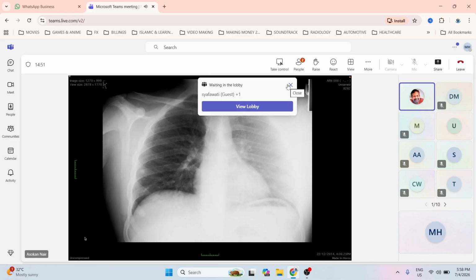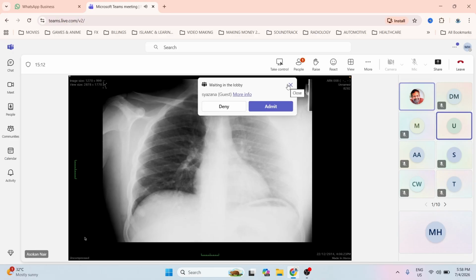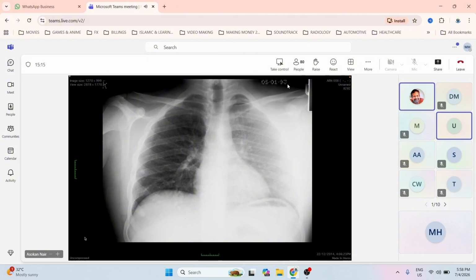So this is a test to check that whatever the abnormality you're seeing there is not intrathoracic but extrathoracic. And why do you say it's extrathoracic and not intrathoracic? Tell me. Because there's equal expansion of the lung, so it's not intrathoracic. Yes, the lung volume hasn't changed. What else? There's no rib expansion or erosion. Okay, fine. What else?